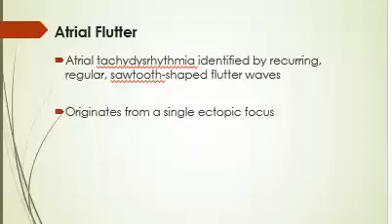Atrial flutter. So atrial flutter, I always think is kind of like AFib's cousin. So same thing is going on. Instead of having a wavy baseline, you have a fluttery baseline, or what we say sawtooth baseline, or better to understand it would be a jagged edge kind of thing. And it actually originates because of a single ectopic focus issue there. So it's not completely all irritated like in AFib. And you can actually count them. Let's kind of look at a flutter one.